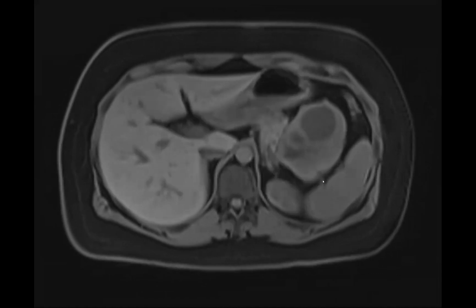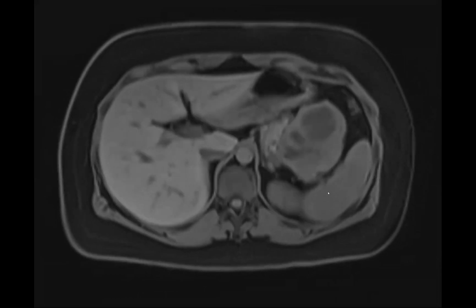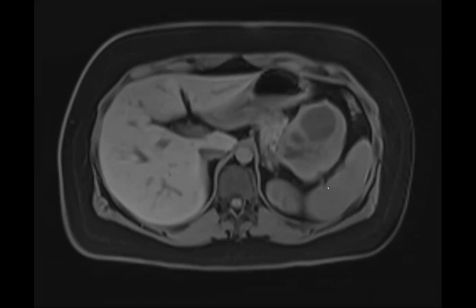But one thing I want to point out is that SPEN tumors, when they're solid, have these pseudopapillae that are all packed together. And as they grow larger, they outgrow their vascular supply and they hemorrhage into the center of the lesion. So even though on CT it might look cystic and solid, it's actually hemorrhagic and solid.